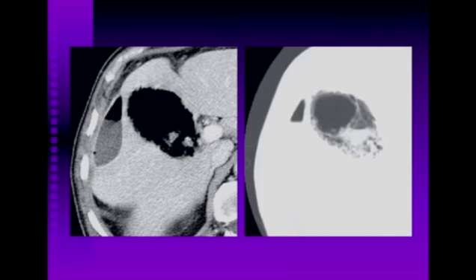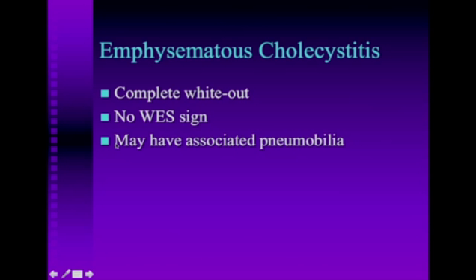Now, ultrasound can be very hard for this other diagnosis, so I have a nice CT for an example. When you see this gas-filled gallbladder, you can use the lung windows of your CT to show not only the gas density but the sloughing of the mucosa and the irregularity. Please note also this extraluminal collection here with fluid and gas. So this is consistent with emphysematous cholecystitis.